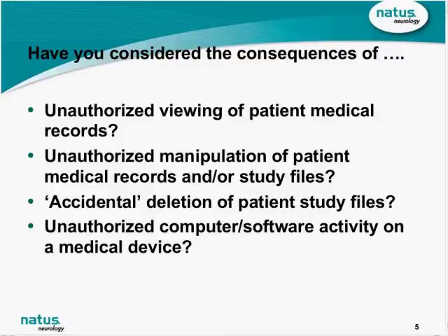And have you considered the consequences of unauthorized computer activity or software activity on your machine that we call a medical device? By that I mean someone installing a program that is not appropriate for the machine.